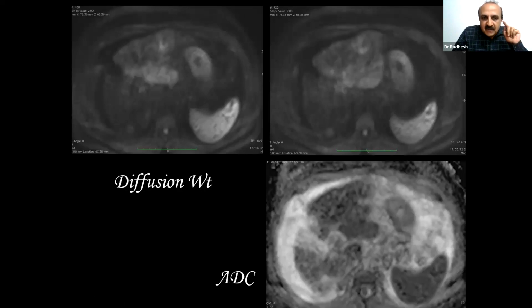Okay. And if again you want to score a distinction, you tell the radiologist, I want a B value of 800. He will understand. B value is the value you assign for calculating the restricted diffusion. You have B0, B50, B100, B800. For the liver, the best B value is 800. For the prostate, we use a B value of 2000. But for the liver, it is 800. So then you start seeing the lesion white.